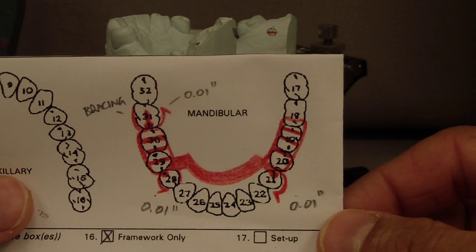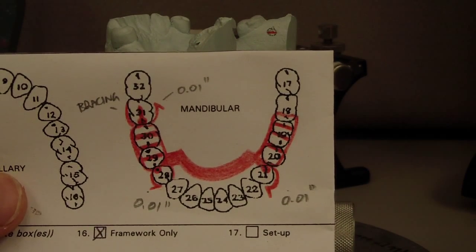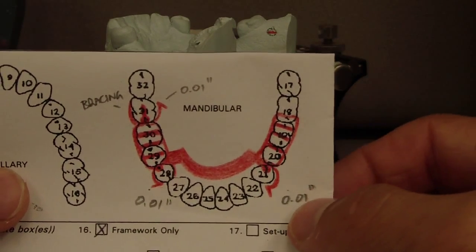Here I just want to review one of the surveying designs for one of the patients when we send things off to the lab. It's an interesting case because we're using an implant as a positive stop. Additionally, I fabricated a few survey crowns. So let's review the basic framework.